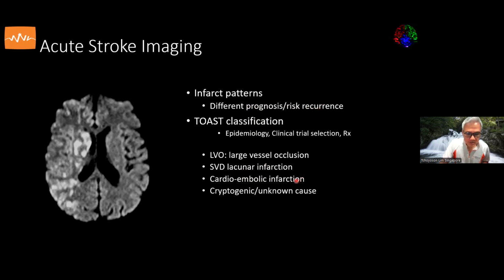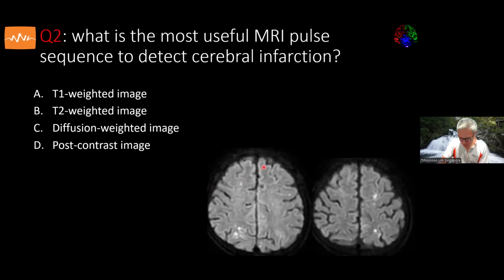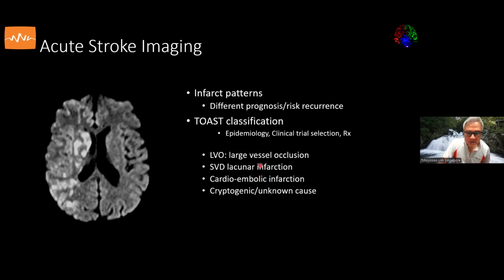So the treatment for a cardioembolic cause is going to be different than the treatment for large vessel or small vessel occlusion. And here you can see there are multiple focal areas, some confluent, on one side only of the cerebral hemisphere. This patient had embolized, artery-to-artery embolization from the internal carotid artery.